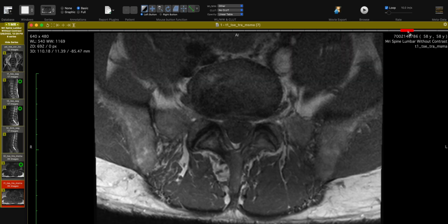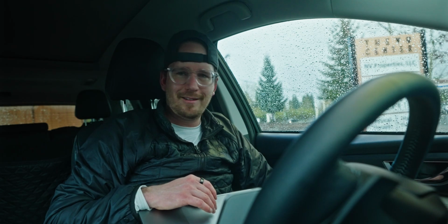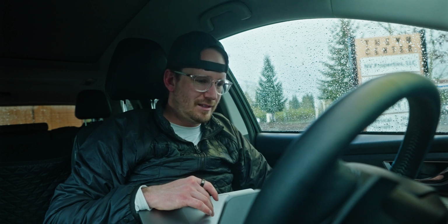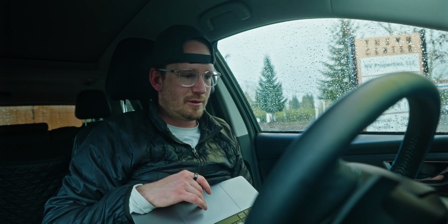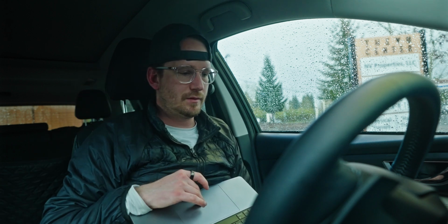I've enjoyed hanging out with you today. Honestly, it looks pretty good. This T1 looks pretty good to my eyes. I've said this maybe five times already, hopefully. I'm a physical therapist. I am not a radiologist. I look at a lot of these things to simplify it for my patients. Take everything that I'm saying with a grain of salt. Hopefully you've gotten some value out of this. I look at movement. I look at functional diagnoses. This is more patho-anatomical diagnoses. I care about these, but I care more about when it hurts when you're moving. That's fixable. That's fixable without surgery.